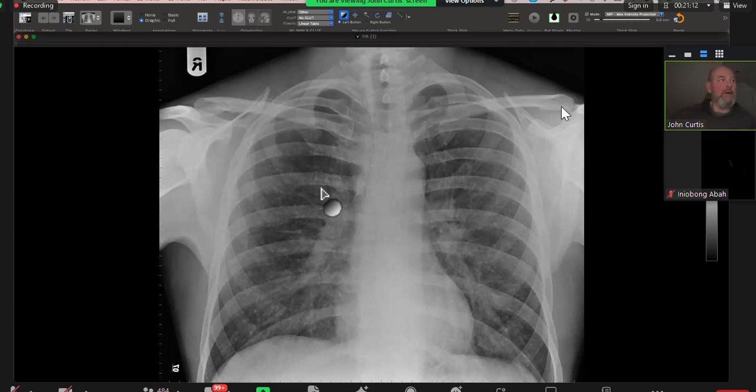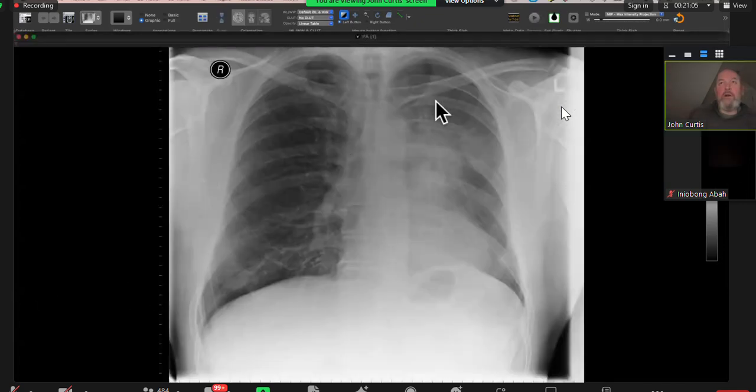Miliary TB. Yes. Most important. Yeah, you smashed this one, exactly as you would expect in the exam, and you suggested sending the patient for a CT scan, the lung cancer multidisciplinary team, but you've still got to keep on looking at the rest of the film. So even though you've got everything right, tell the examiner you're looking for evidence of metastases, and then there you have it.